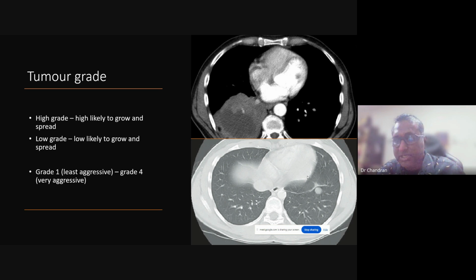For example, in the image down here, you can see one tiny little area on the left side, very round, very similar color, all right? And we say very well defined, very benign looking. Then we say that this is less likely to be high grade. I'll say, okay, this is low grade. This is basically a subjective assessment by the doctor. We have no basis to say that this will for sure not grow. It's not like that. We think so because of the appearance.